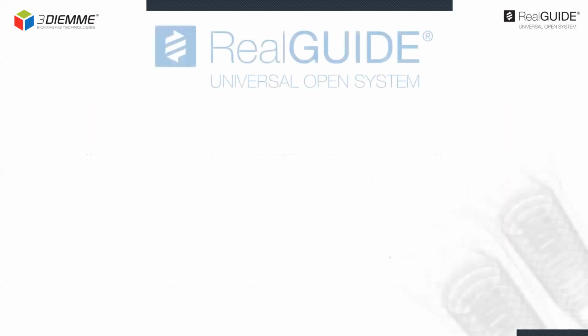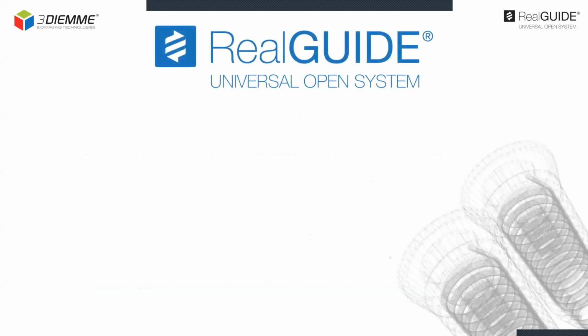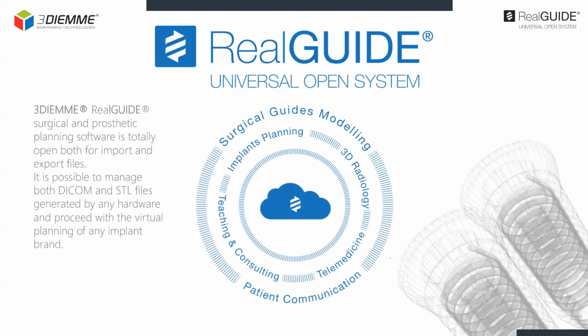But what is RealGUIDE? RealGUIDE is a totally open guided surgery and prosthetic planning software, which means that it's possible to import both DICOM files for hard tissue information, bone and teeth, and STL files for soft tissue information, from any equipment: CBCT, desktop scanner, intraoral scanner, it doesn't matter what brand is used for the data acquisition. Once the necessary data is imported, the software will be able to match the files to get all the information we need to proceed with the implant planning.